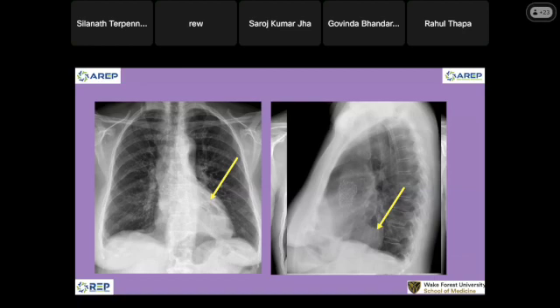On chest radiograph, you don't have to specify whether we have a sliding hernia or paraesophageal hernia. You really can't, because you cannot see the GE junction. The whole thing is one opacity everywhere. On the chest radiograph, we just say enlarged hiatal hernia. And I can't see the heart. I don't know where the heart is.